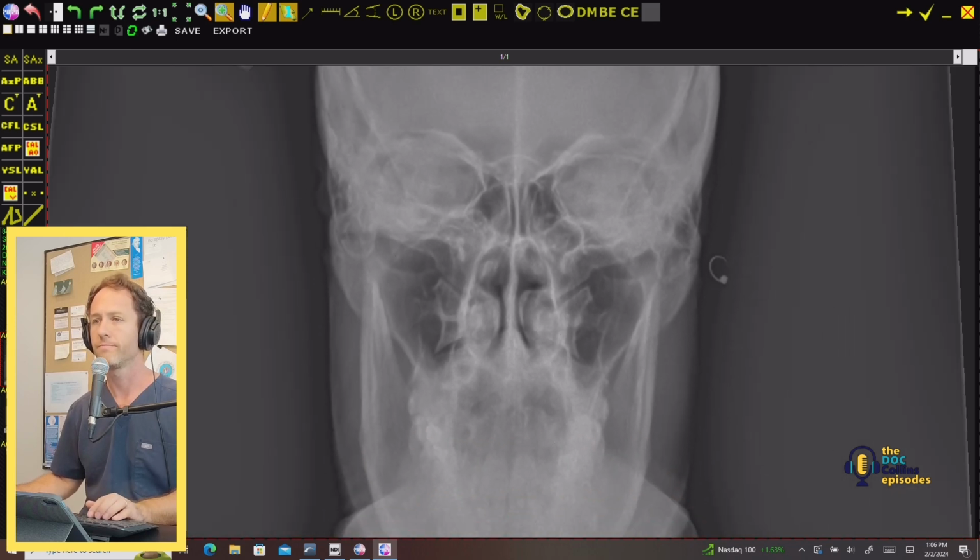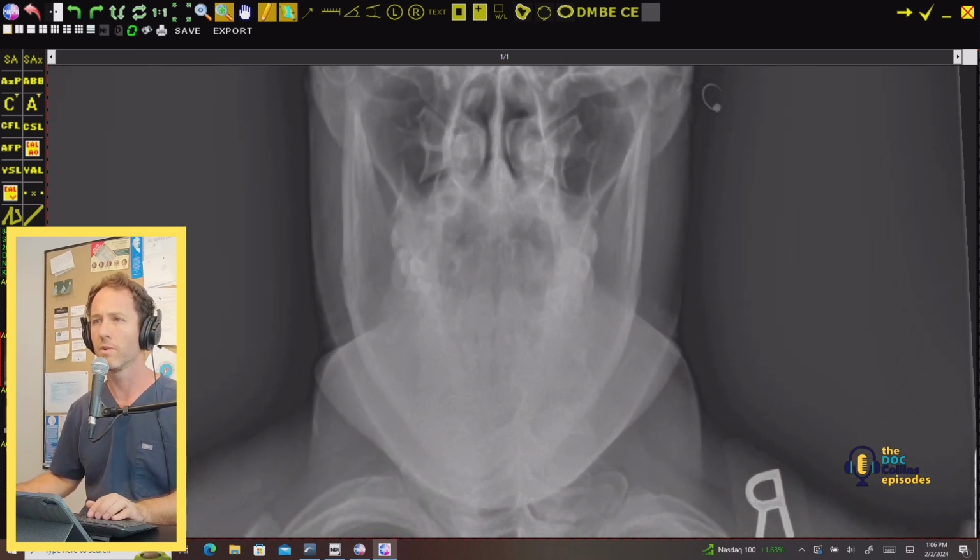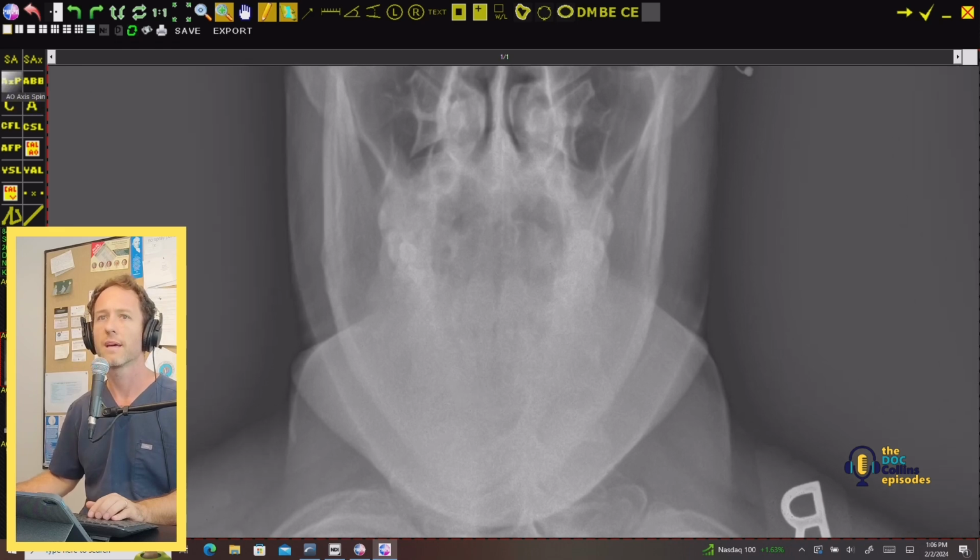All right, so in my workflow when I'm doing my films, I start with the AXP, but it's really the dens. It's going to be several points in one tool on the software. And I'm just throwing these up quick just to get them on the screen, eyeballing, and then we'll zoom in.